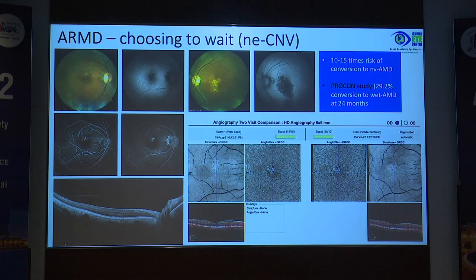in prevention of conversion of non-exudative to exudative. It did not. So if you keep giving injections seeing a non-exudative membrane, that's not a good idea. So you should wait. But as and when I will see that this membrane will become bigger or new shoots will come, even if I don't see SRF on the OCT and the patient becomes symptomatic, I can treat earlier.